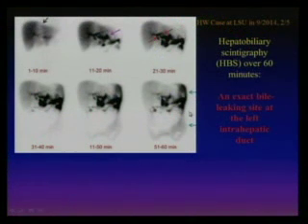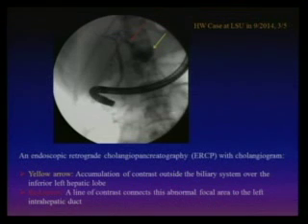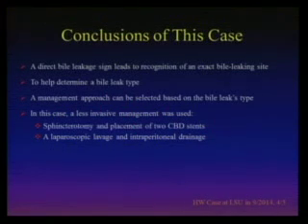Of course, we published this. Sandra left, she wrote this, and then we got onto this cover page. We really like this image. They did the ERCP right after that, and they confirmed that's the leak tract and the abnormal focal tracer accumulation. Then they did the surgery. This is the first case I saw that was really that clear to direct where the leak comes from. Of course, once you see it once, you will search for it and see more and more cases, and you can tell them exactly where the leak comes from.